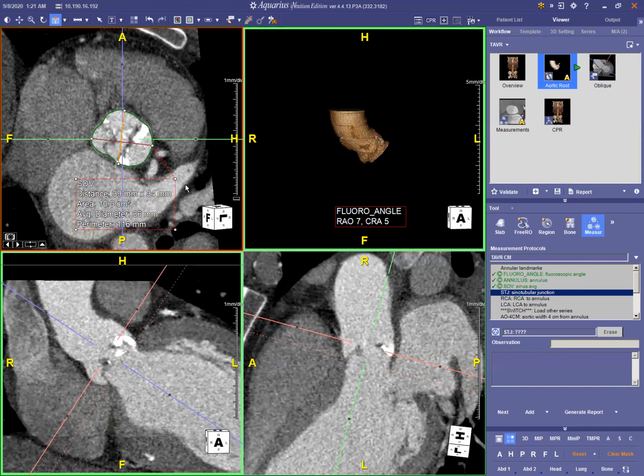And then we'll do the same until we bring out the left main coronary artery ostium. That's more like it in terms of distance. And C for capture. And everything is in the output panel. We'll hit send, pick the server, and then hit OK. After sending, we'll hit delete all so that, again, the batches of images don't mix together.